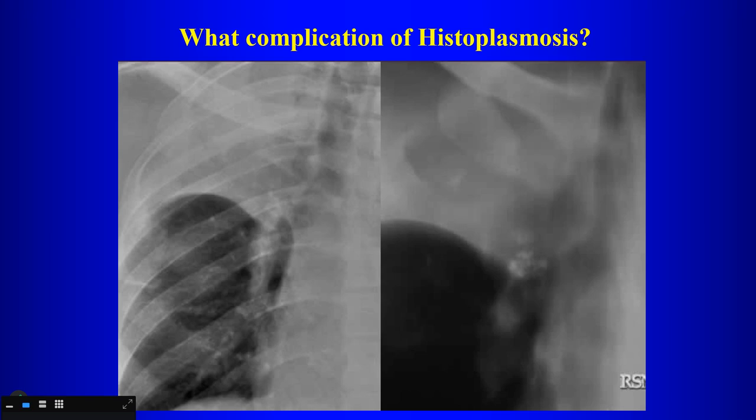Well, but what's the finding on the chest radiograph? Follow the rules, man. I mean, there's like a calcified. Anybody can look ahead and spit out the answers, right? But you've got to earn them. All right. What's the finding on the chest radiograph?